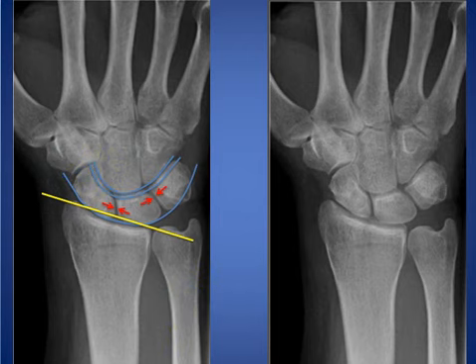These 3 lines should remain unbroken. So we have 3 arcs that should not be broken: at the proximal carpal row, at the distal aspect of the proximal carpal row, and at the capitate and hamate proximally.